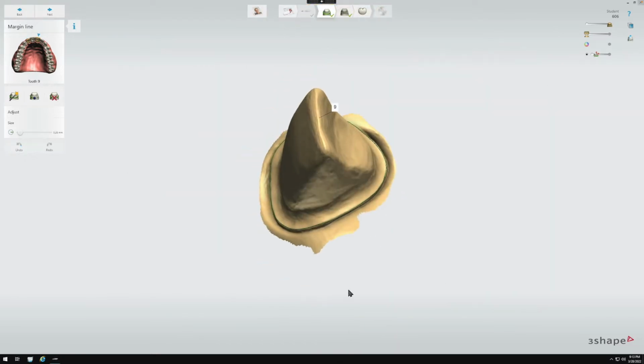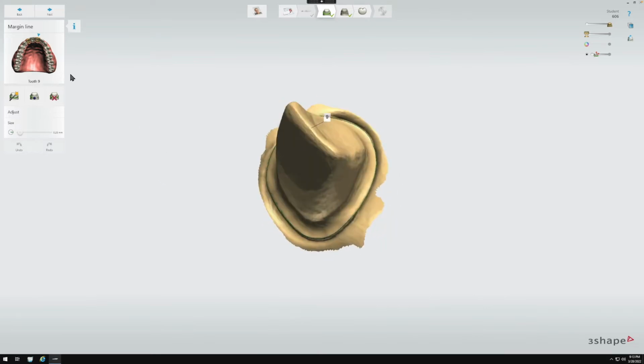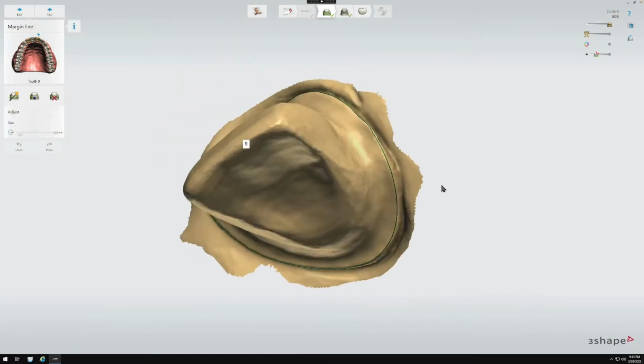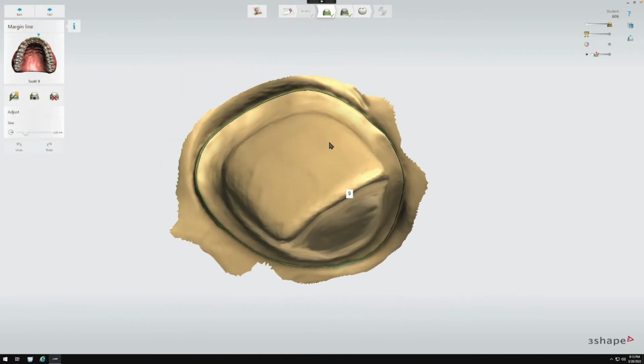So we're going to go ahead and do the same thing here for the following tooth, just because I selected 2 teeth in the lab slip, this case setup being our lab slip. So I'm going to go ahead and do the same thing. Again, I'll speed through this.